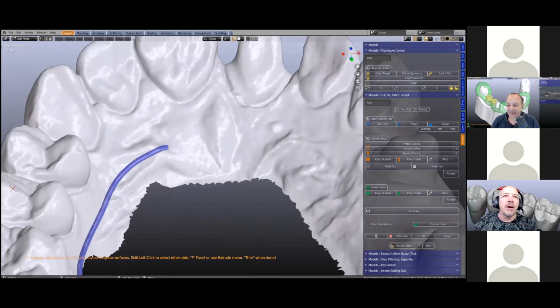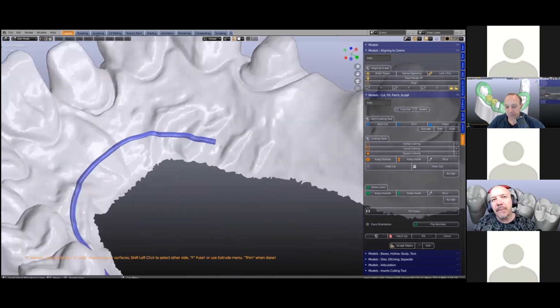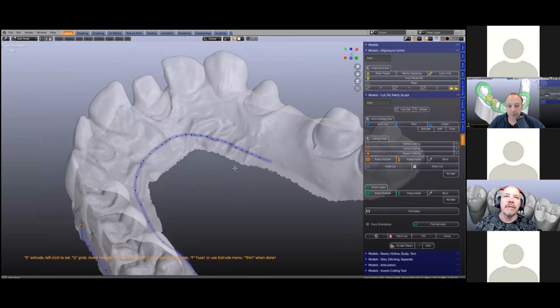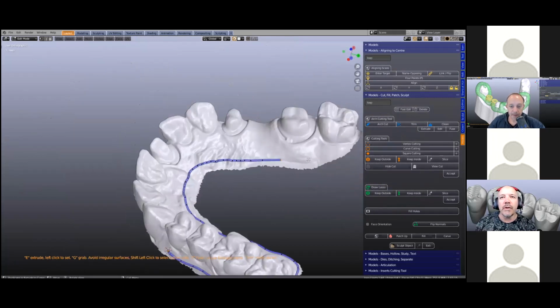Notice that in these hills and valleys, I call them hills and valleys, like crevices or concavities and convexities, whatever you want to name them, I've increased my vertex number that I'm putting down. And this is because we want this cutting tool to cut through our mesh. So we can see all of these vertices here, okay? It's very important, corners and so on, you put more vertices down, flat surfaces not.